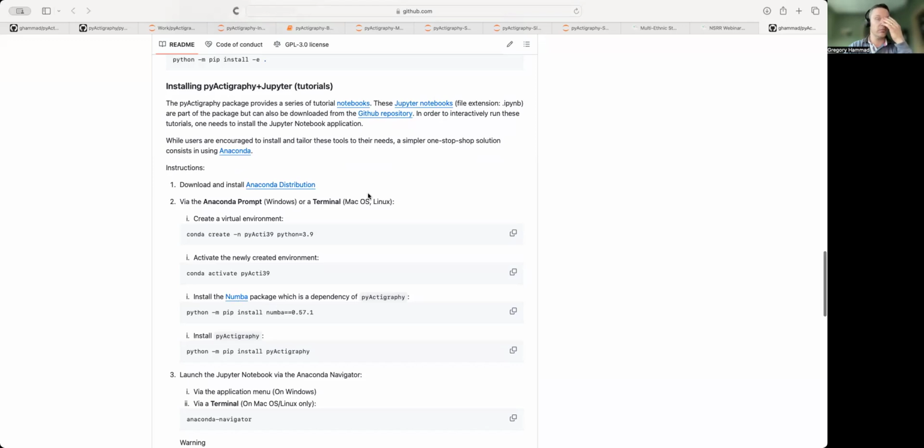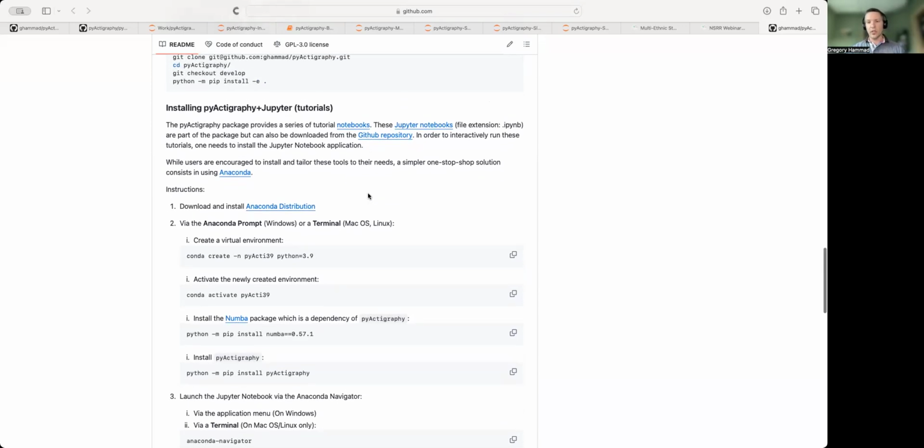So I would encourage people who can manage their own environment to do so and stay away from this kind of tool. But I have to admit that Anaconda did a great job in packaging all the tools that we need into a single software. So if you want to install everything in one go, especially on a Windows machine, that may be the way to proceed. That's why we give instructions here to do it like this.